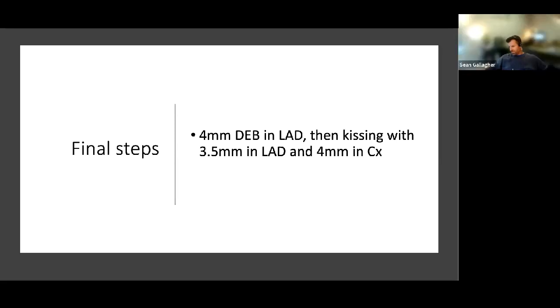Well, because the vessels kind of mold together. I mean, they don't make up their combined diameters. There is a formula for working it out, isn't there, of what they come out at? I can't tell you what it is off the top of my head. But the way I do these procedures, I tend to optimize both limbs of a bifurcation independently.